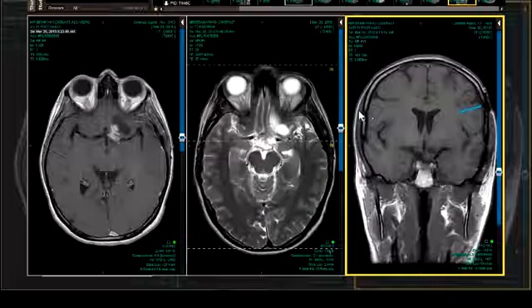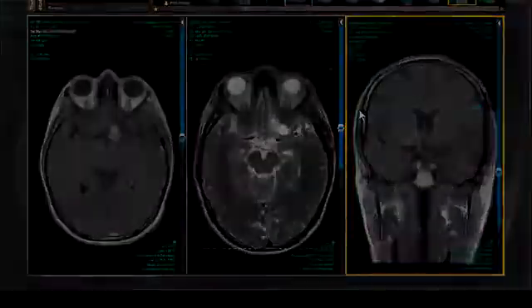Okay, it's elevating the middle cerebral complex. It's pushing the anterior, what structures are they going to have to deal with, right? Does it matter? Would you do a pterional approach if it was on the left side? Yeah. You would? To the midline, yeah. Because you have to work through the fissures of the brain, okay?